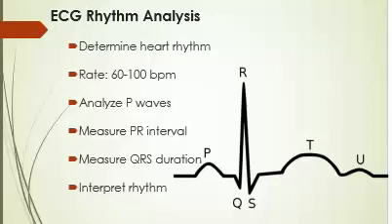You want to make sure that you are doing this the same way all the time. Okay, as long as you do these things, guys, you will be able to analyze your rhythm strip and move on from there. Remember the blocks. I don't want you to stress yourself out about the blocks, but this is pretty much what it is.